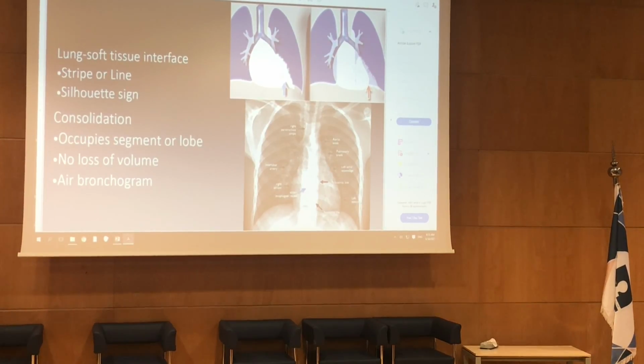When I don't see it, this means it's in the part of the lung that is actually in contact with the heart. And we talked about which part of the left lung is in contact with the heart and actually formed by it. It's the lingula, right? Because we said that the upper lobe of the left lung, when it surrounds the heart, there is this cardiac notch and the lingula is formed.